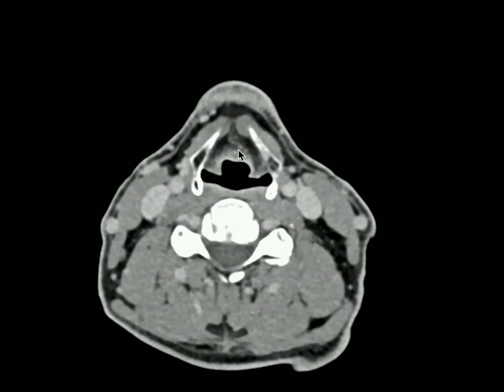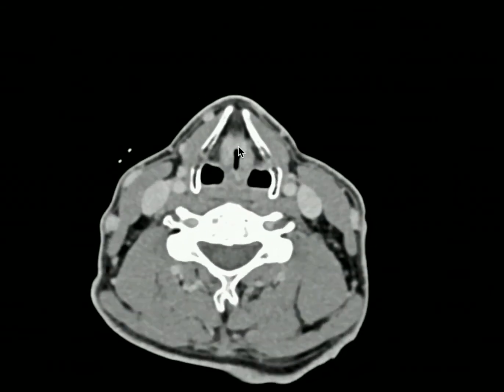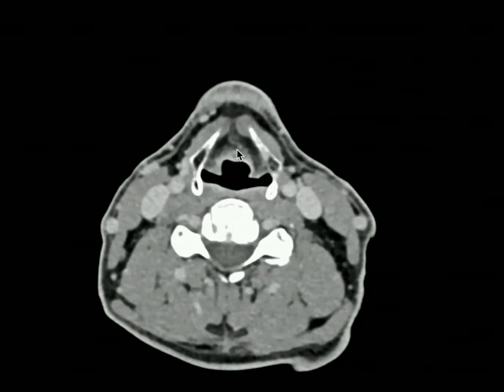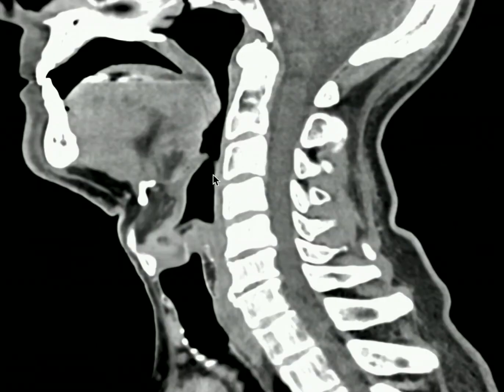Scrolling down more inferiorly, we see the thyroid cartilage come into view, and we'll see the thyroid notch anteriorly dip down just a little right here. And coming just below this point on the thyroid notch, we have the thyroepiglottic ligament extending from the thyroid cartilage right here and extending posteriorly and up to go to the petiole or base of the epiglottis above. Here again on our sagittal CT, we can see the petiole or base of the epiglottis right here, to which the thyroepiglottic ligament will attach.